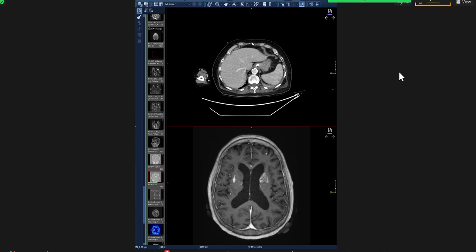So, of course, it could have been a vascular occlusion. And if a vessel was occluded, do you know which vessel would have been occluded to have brought this abnormality? We didn't see a vessel occlusion in this case, but if it was supposed to be, it could be lenticulostriate branches of ACA or MCA. Well, okay, but usually the artery of Percheron is the one, or the basilar tip is the one that might have also brought on this picture. Okay, those are two things.